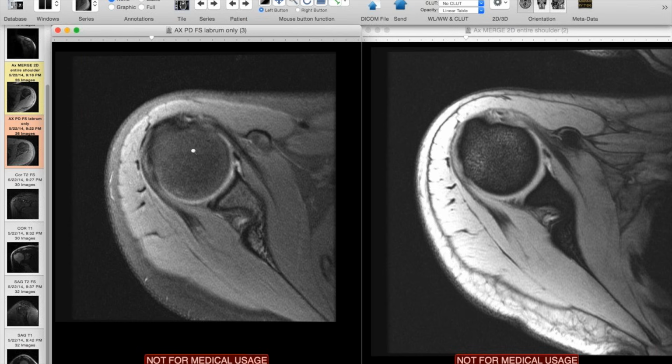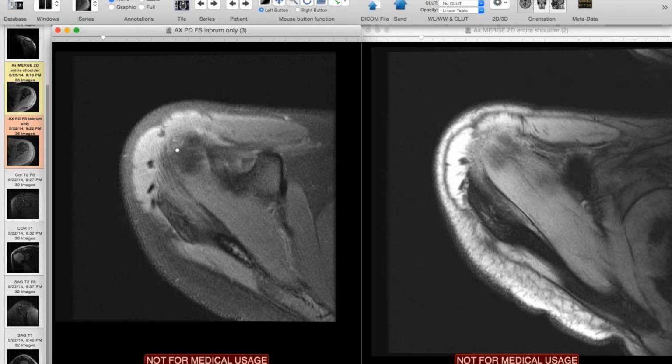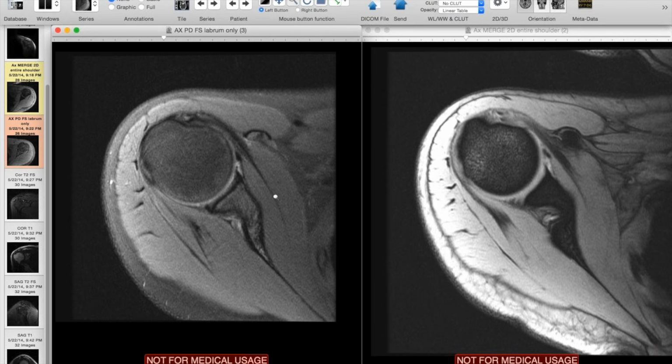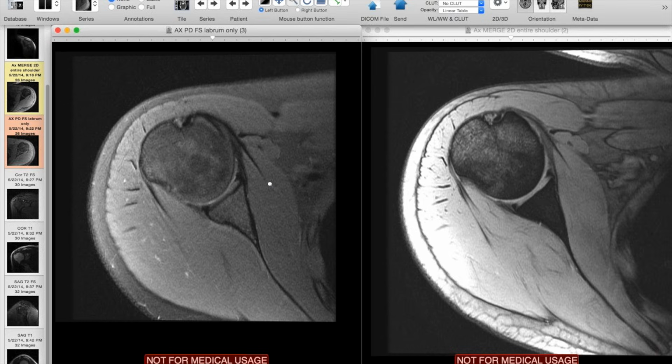If you get practiced at it, you should be able to see the biceps tendon somewhat as it comes up and across the humeral head on axials, and you may catch a glimpse of this structure like this, which is the long head tendon coming over to the supraglenoid tubercle to insert. That's useful. It's better seen on MR arthrograms when the joint is distended.